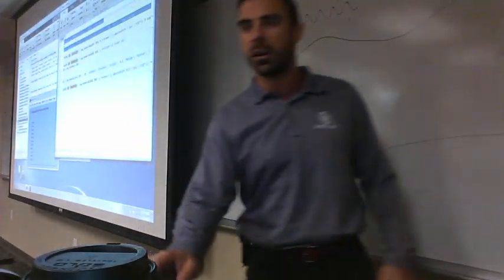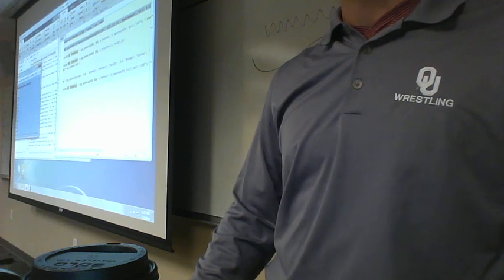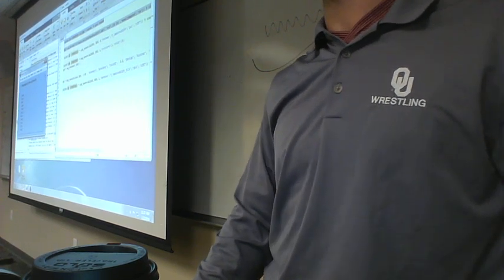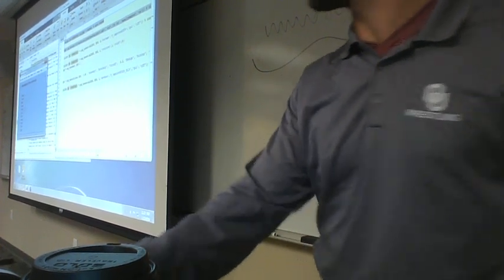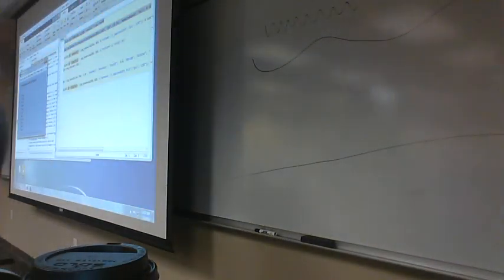Okay, so let's see here. It's still thinking. Remember, it took us a while on this, because we're importing this massive first data. Once we start saving it in EEG Lab format, it's going to get smaller. Yes, sir. Question. Can I do a run section on that? It's saying it's invalid.